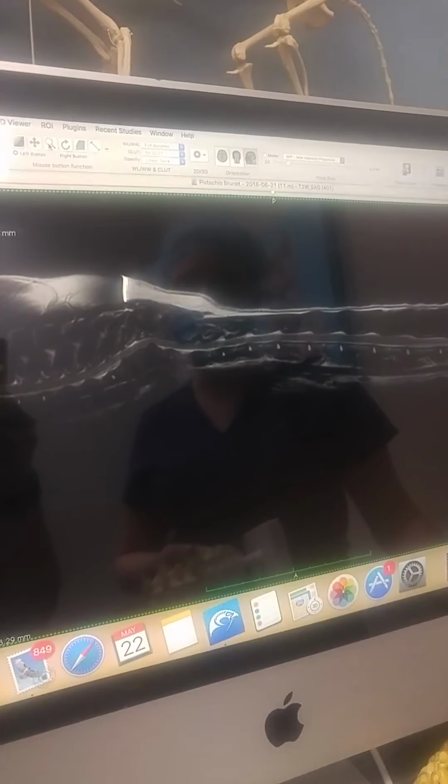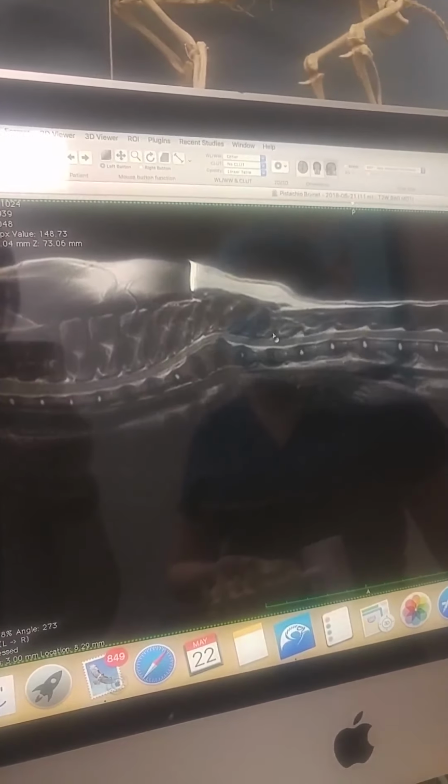So here we have a bump there, okay? And what I want to know when I see that, with my most detailed images, is what's happening to that spinal cord, really. So let's take it one at a time. What a good picture. That's why we always say the MRI is our most detailed modality, much more than a CT scan, because a CT scan is like looking in black and white, and this is fully HD.